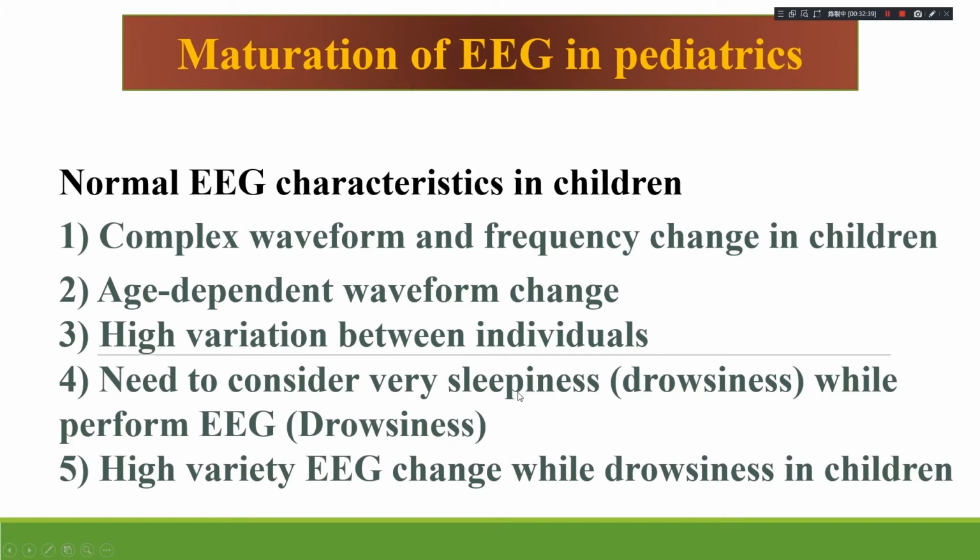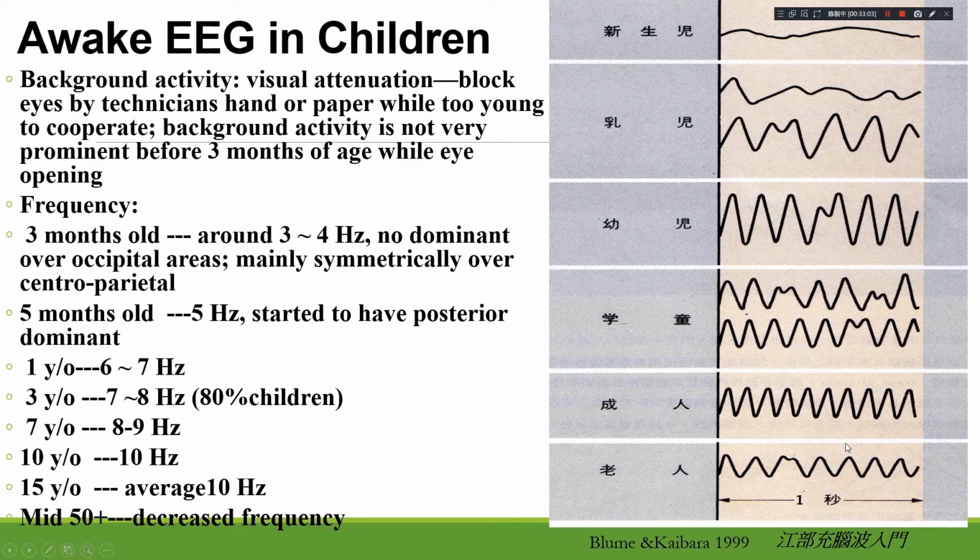We need to consider that children usually come for the EEG examination very sleepy, because we usually order an EEG recording and they come to our lab really drowsy and sleepy. So at this time, we need to be very cautious in interpretation of these waveforms, and there is high variety of EEG change while children are drowsy.